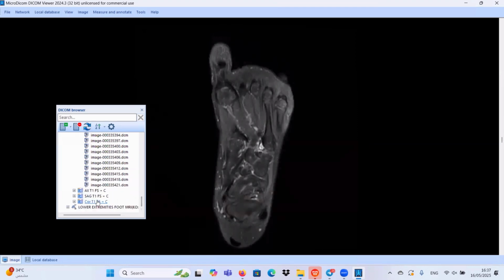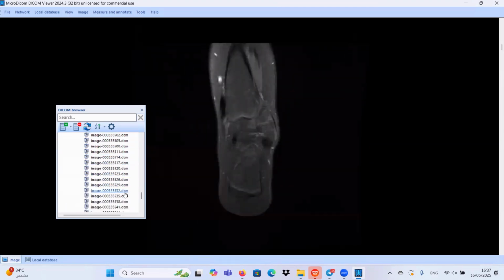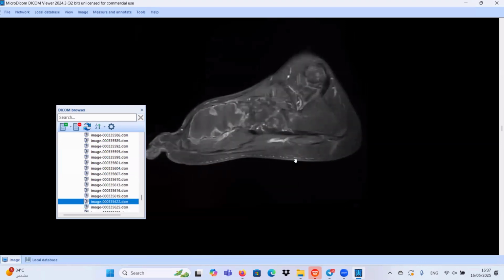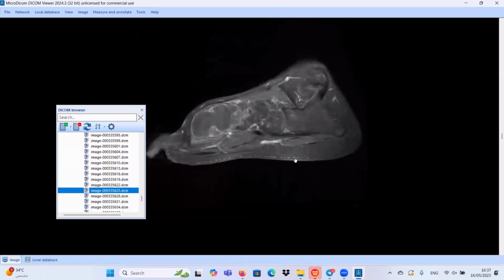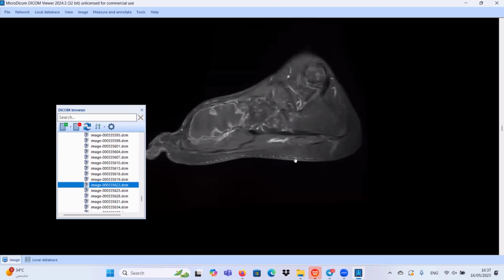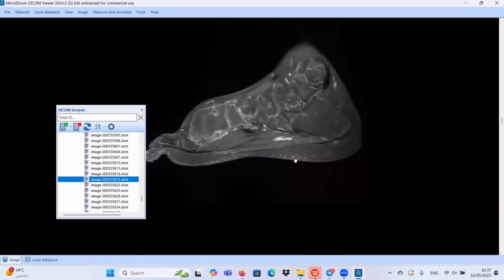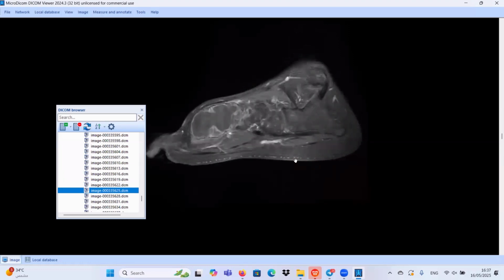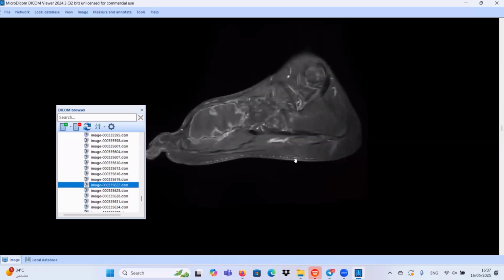So let's see together the post-contrast series. In the post-contrast T1 fat-set, PD fat-set imaging, I can appreciate that there is a rim enhancement of the mass, and posterior to it, there is some soft tissue enhancement as well. There's no definite soft tissue component. Actually the hyperintensities within the bone are showing thin rim enhancement. Right. Let's conclude this case.